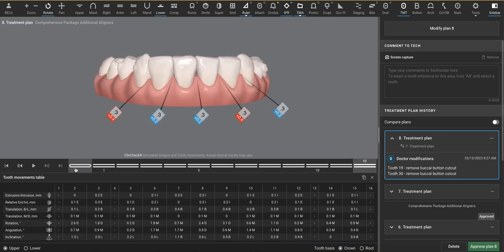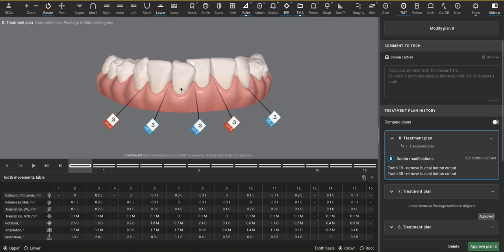But the teeth are crowded to begin with. So there's something called timing of IPR. The IPR doesn't necessarily need to be done all at tray 1, 2, or 3, or whatever Invisalign says. I think here they had recommended, so when these turn yellow is when IPR is programmed. What I would say is tell Invisalign to turn off the IPR on tray 1 between 24 and 25.